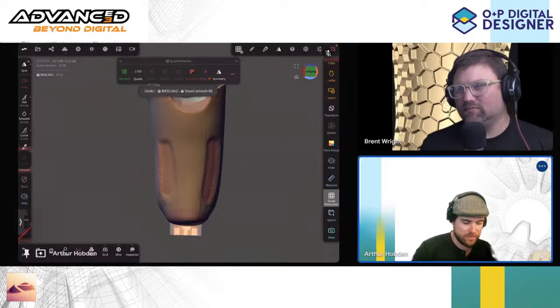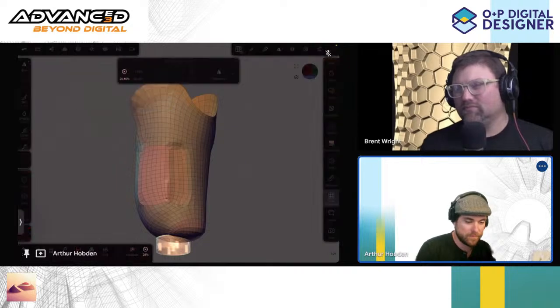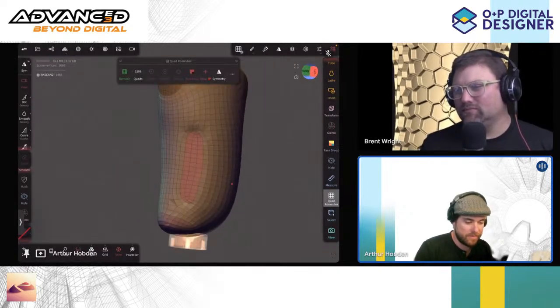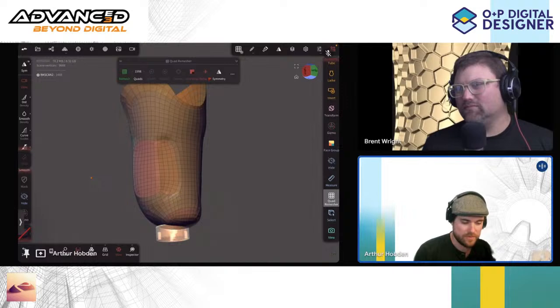Whoops, that was not right. Which does allow you to sort of continue on, and if it looks muddy, which is kind of what happened here, remeshing a quad mesh is usually the best thing to do. It just sort of gets rid of it. There we go. And if you're at all worried about the relaxing of the shape, let's go back once or twice, even thrice.